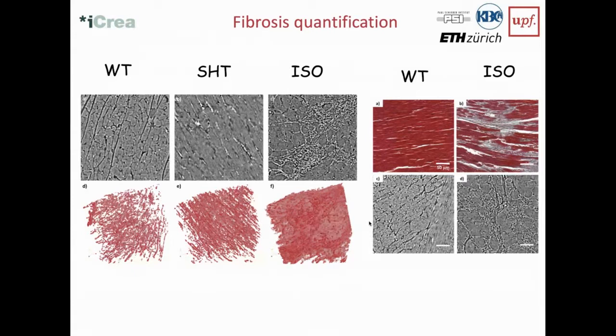We still don't have ideal ways of doing this, but we try to infer it. With this phase contrast imaging, we can actually directly image this. Here you see, for example, normal tissue. This would be tissue of hypertension, in this case a hypertensive rat, where you clearly see much more of this white structure, and when you segment it, it's much more obvious. So this is fibrosis induced by high pressure. And here you see a lot of fibrosis, and this is induced by a local infarct. So you can really quantify this in this way.